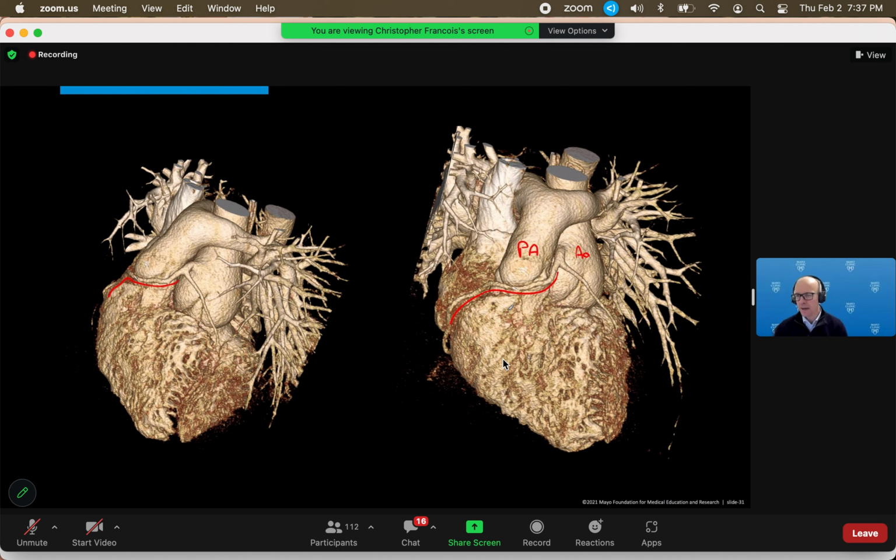And are you worried about this? Is this going to cause chest pain? Not sure. This is pretty superficial. I'd be worried if somebody tries to operate, but otherwise, I'm not sure, really. Yeah, exactly. So, this is not going to cause angina. This is not an intramural or malignant course. This is an incidental finding.